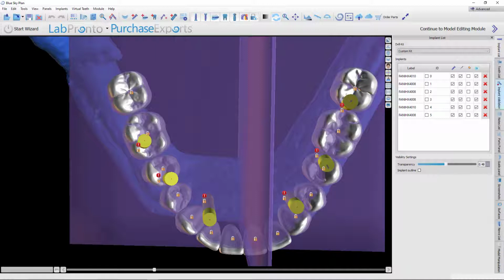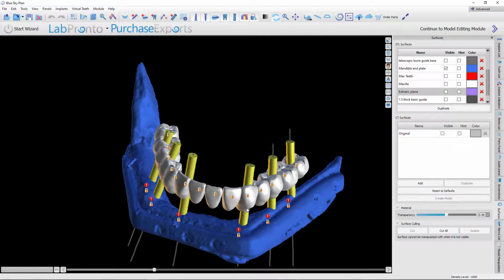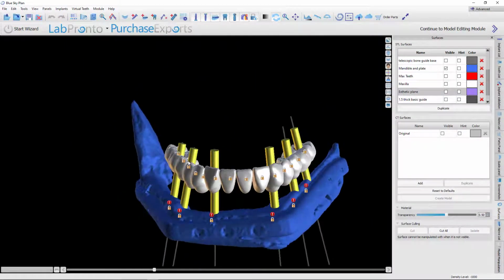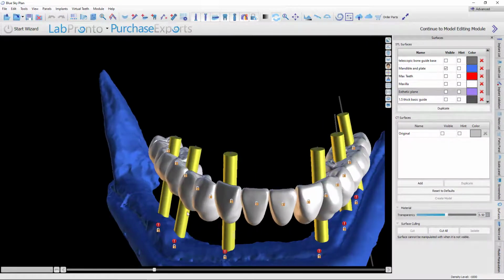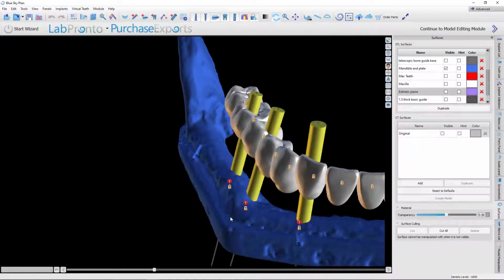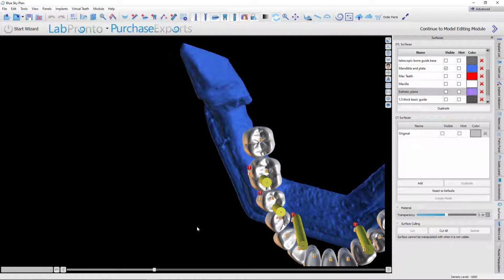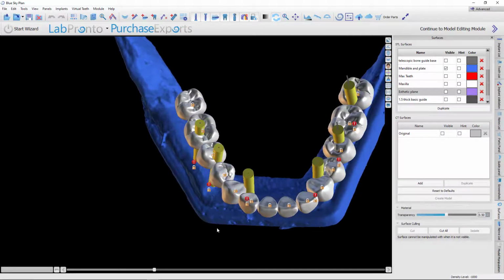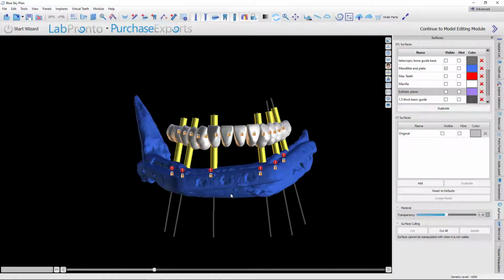Okay, that plane has kind of done its job. I don't need it anymore. I'm just visualizing the teeth positions. So it makes a big difference. Now I don't worry about ending up with a facial screw access hole because I'm sticking out this way. When Danny does this surgery, he's going to go in and it's a fibula, right? So it doesn't have any of the normal anatomic landmarks that would lead him to know that he needs to position this right here. Rather, the guide is going to control all that, and it's all been predetermined by a prosthetic wax up, let's say digital wax up.